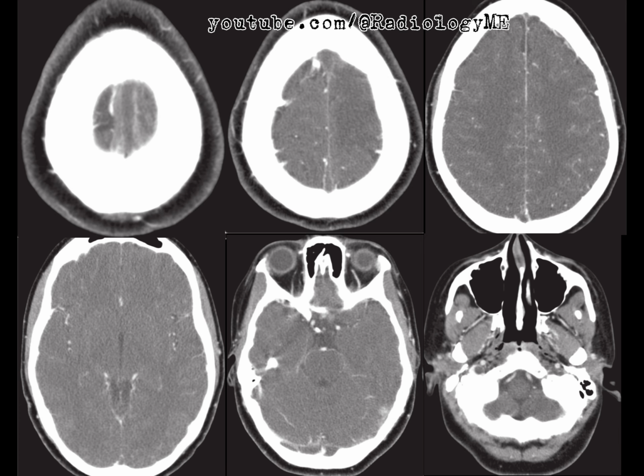All of this is highly suspicious of extensive thrombosis of the dural sinuses, which would be quite a significant finding in this patient. Beyond this, we see an area of low attenuation in the left frontal lobe, suggestive of an infarct, likely secondary to this thrombosis. Given the extensive nature of the thrombosis, it would explain neurological symptoms the patient might be experiencing.